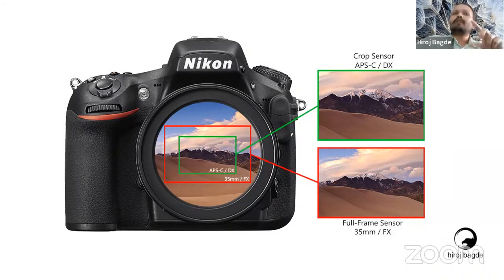But again, what is the purpose of you buying this camera? You should know first. Because if I am a macro photographer, I will just carry out macro photography. For me, even a crop sensor is good. It is since so many years of practice, I know that even a crop sensor will give you a good image.